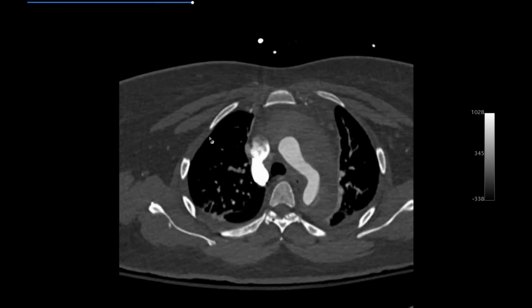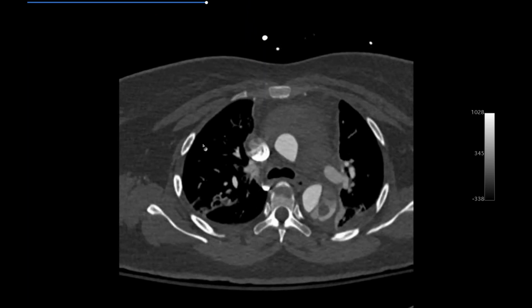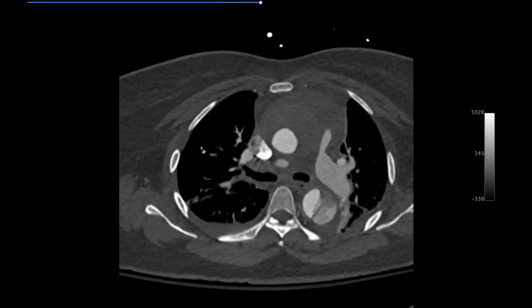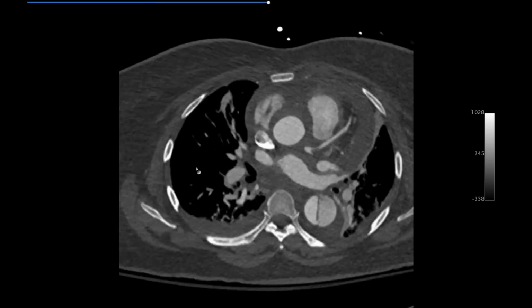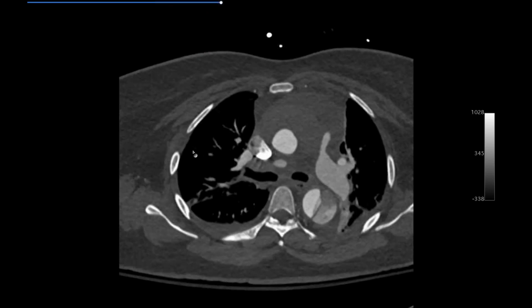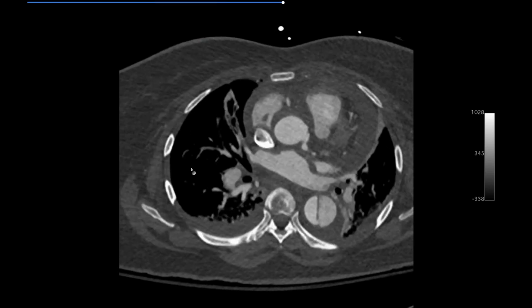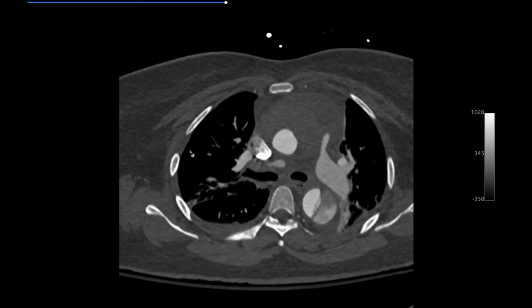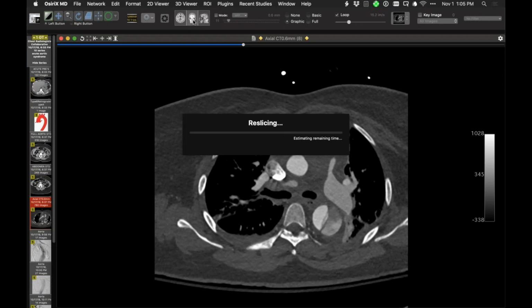All right. So here we see that we have clearly a communicating aortic dissection that starts about there. I'll show you some more, and involves the descending aorta. And then there is substantial intramural hematoma in the aortic arch and the ascending aorta. So let me make a coronal out of this, and I hope it doesn't jump too much.